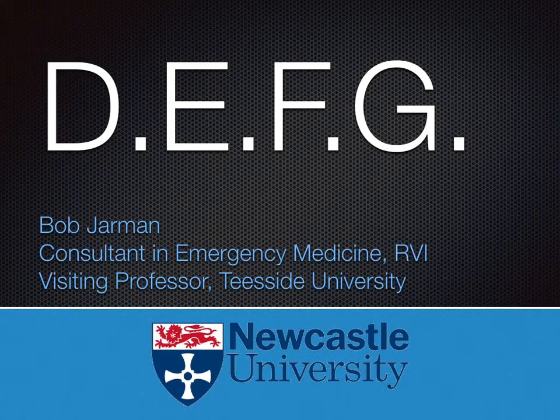Okay, you've learnt a lot about echo now, but sometimes it's very difficult, especially in a pressure situation. You may see an echo image that is really hard to interpret and it's just sometimes overwhelming. So we developed a system called the DEFG system, and this is a system that you can apply to looking at echo images to help you find all the information you need in a shorter amount of time. We think it's great.